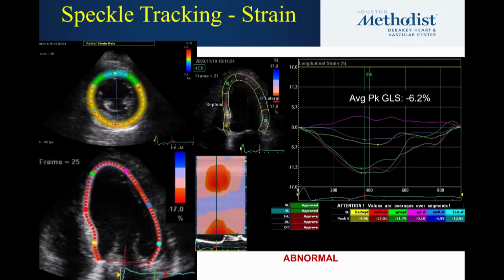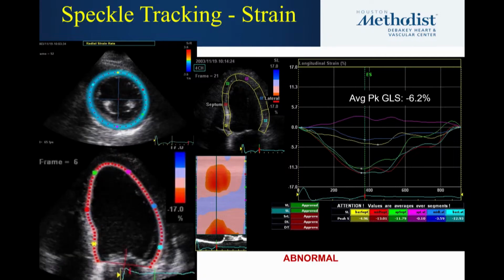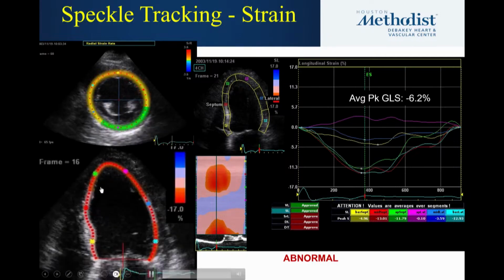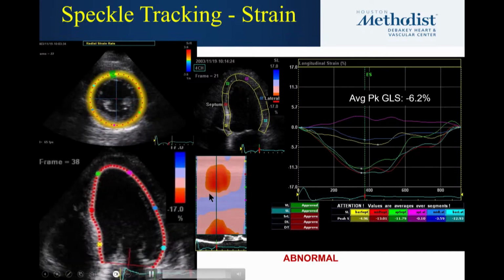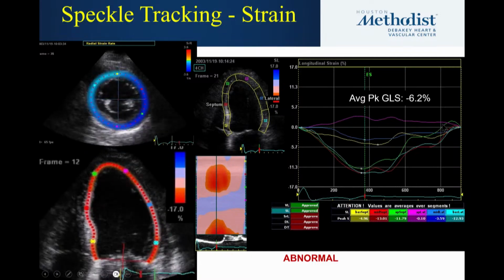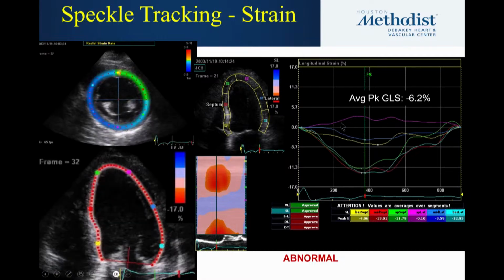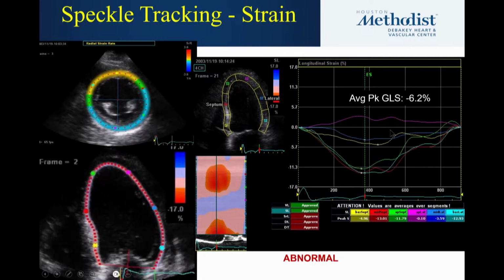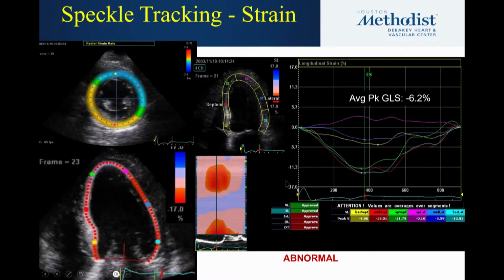In contrast, this is a cardiomyopathy, non-ischemic cardiomyopathy, but still having a fair amount of regionality in deformation or contraction. You can see that very nicely here because this is all broken away. But to me, I see it even better here because you can see that this is hypokinetic, and this is practically dyskinetic, and here is almost akinetic. So we have segments with different forms of strain.